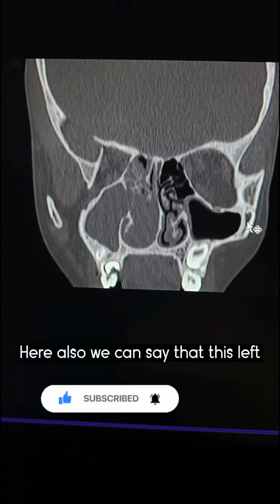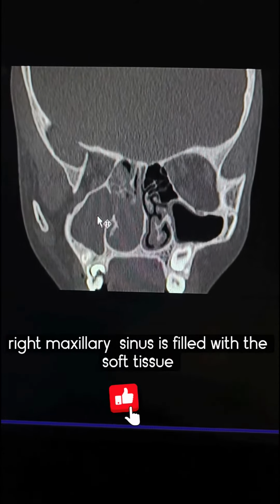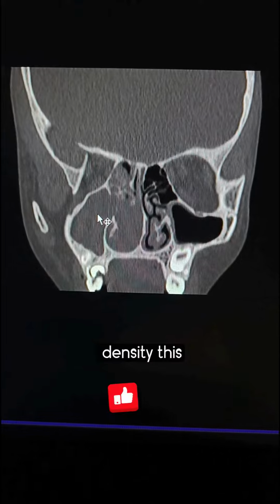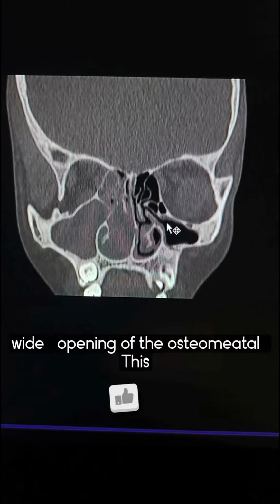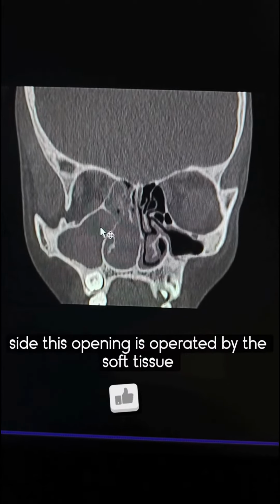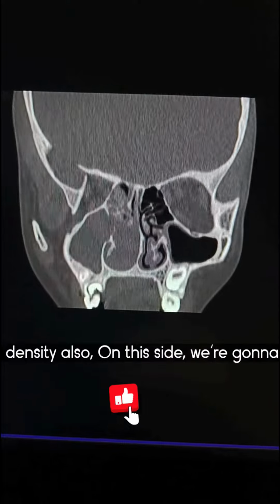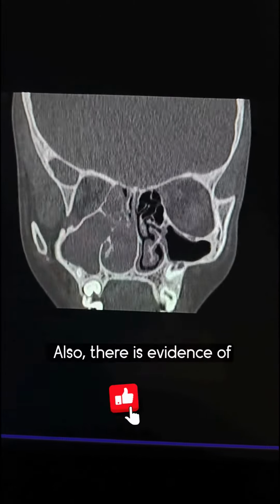Here also we can say that the left maxillary sinus is filled with air while the right maxillary sinus is filled with soft tissue density. On the left side there is a wide opening of the maxillary sinus in the meatus, while on this side the opening is obliterated by soft tissue density. Also on this side we can appreciate that the ostiomeatal opening is widened.